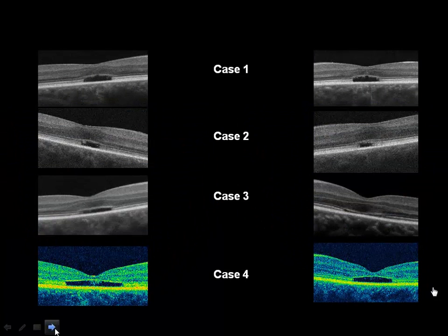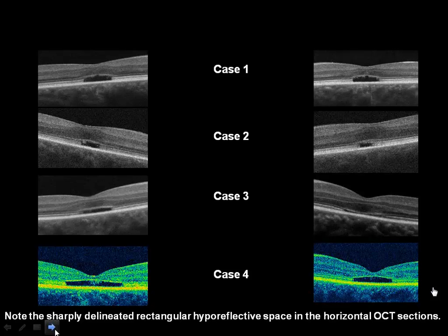Okay, so what do you think these patients have in common? What these patients have in common is a dramatic decrease or maybe complete absence of cones. And these patients are actually rod monochromats. So they have rods, but they don't have cones. And they also have virtually no color vision.